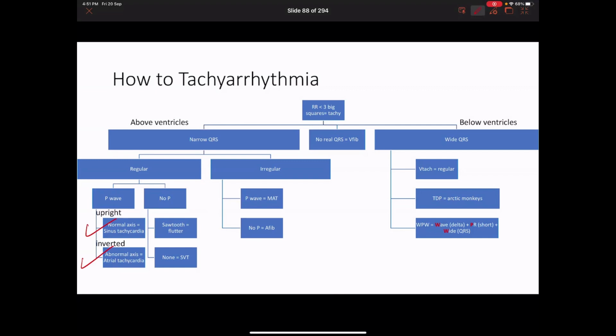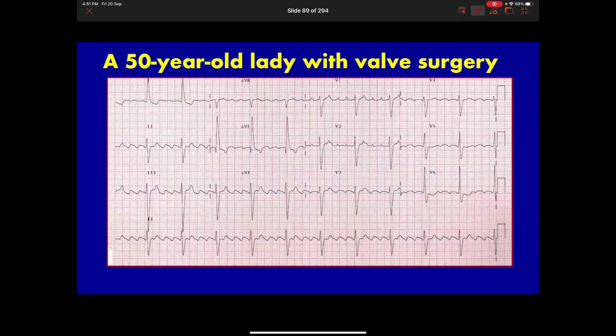Yeah. Okay, now what about this one? This is very high yield. You'll get this in the exam 100% or 90%. Very important. This is one of the ECGs that's just pattern recognition. Like you just look at it and you know. Flutter, atrial flutter. Yes, exactly. This is the sawtooth pattern. Okay, this is atrial flutter.